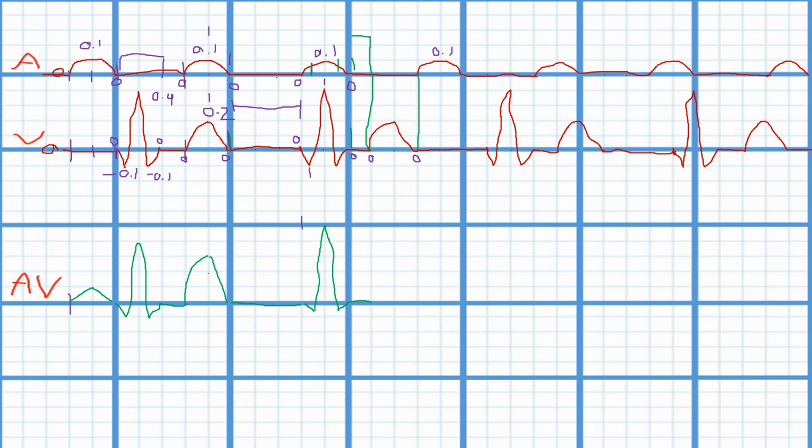All right. Over here, it's just the ventricles. We got a T wave. All right. And so that's going up to 0.2 and going down to 0. All right. Right here, we have just the atrial activity in this part of the graph. Right? So there's just atrial, no ventricular activity. So we could just copy this. 0.1 to 0. All right.